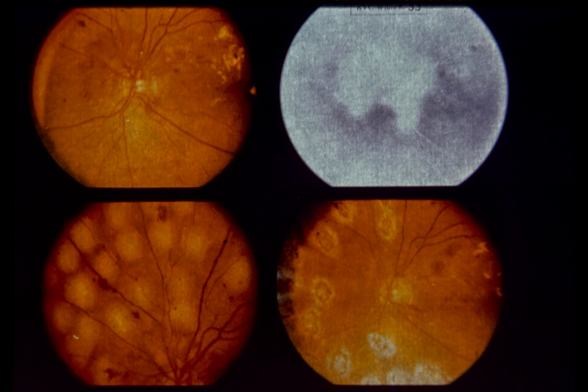Lower right, 2 months following treatment, note complete regression of disc neovascularization. Macular lipid was unchanged and visual acuity remained 20/40. Comment. The diabetic retinopathy study demonstrated that xenon arc and argon laser photocoagulation performed in scatter fashion as demonstrated here are equally effective in reducing the risk of recurrent vitreous hemorrhage and subsequent visual loss in patients with neovascularization on the disc.